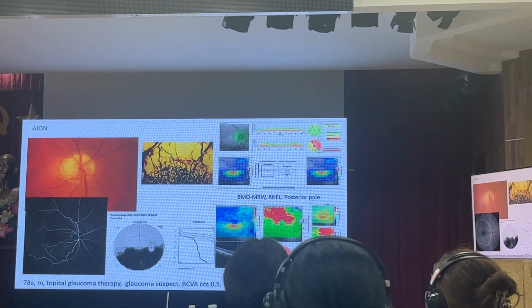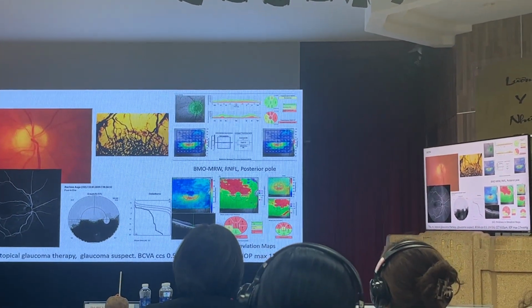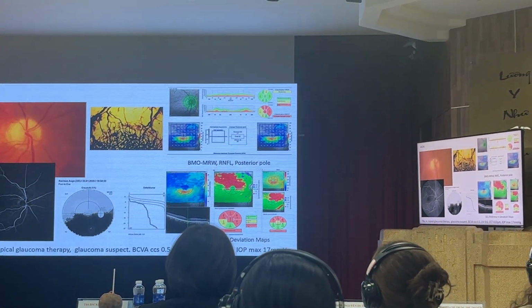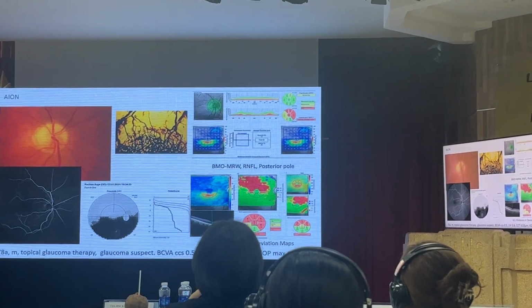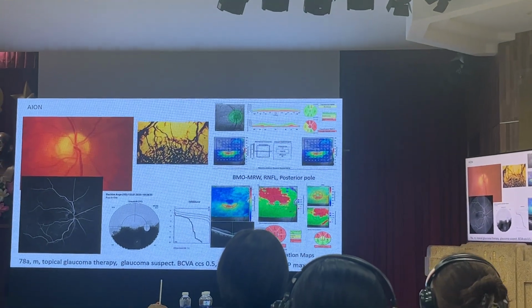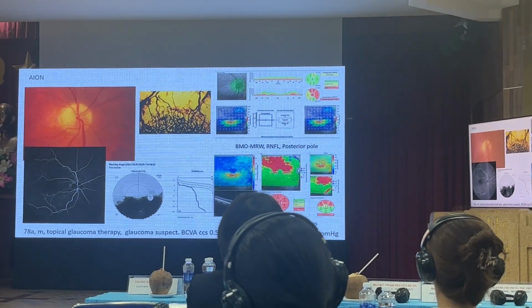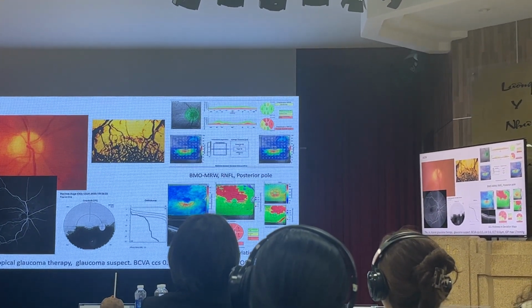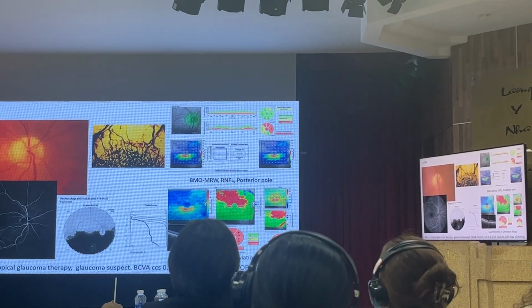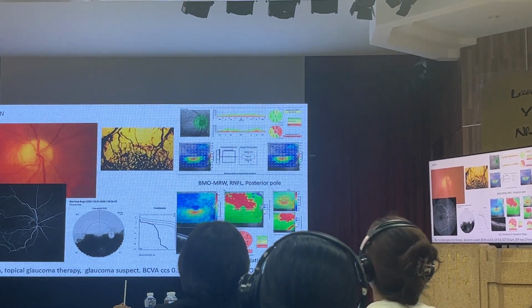And when we look at this patient, we see a typical horizontal orientation of the ganglion cell loss in the macula. The ganglion cell loss belonging to the nerve fibers of this upper optic disc area are atrophic in red, and the lower preserved part seems to have no affection of the ganglion cells.